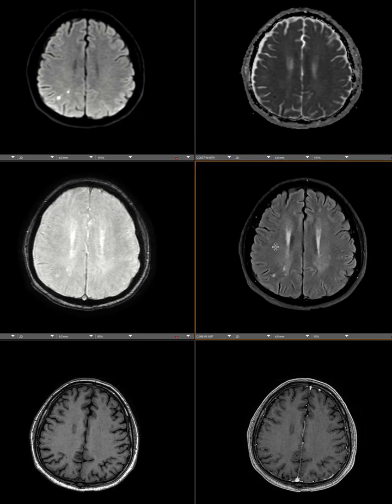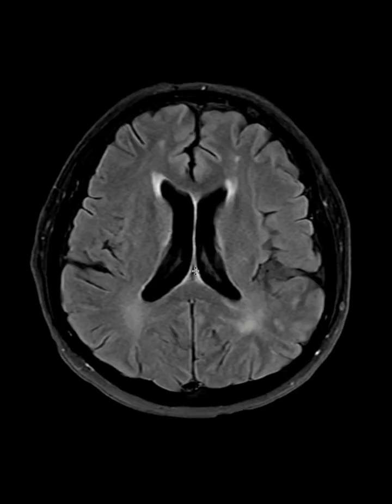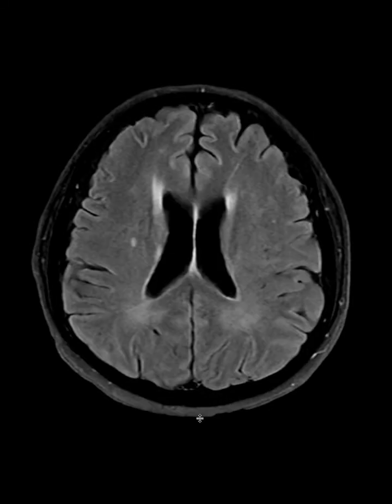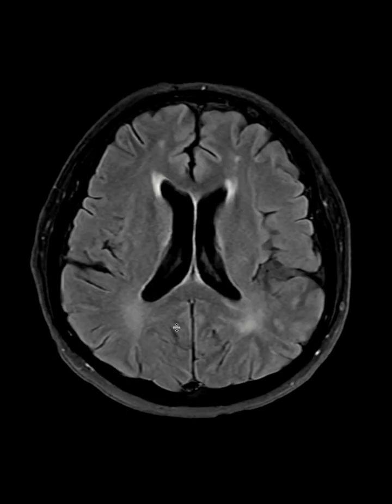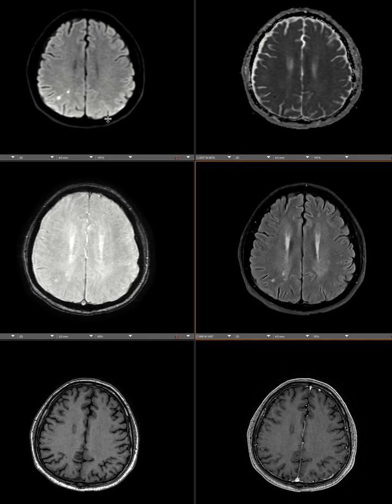And then if you look at this sequence, which is FLAIR, we know that this is CSF which is dark, and then the scalp is also dark here because we have FLAIR FATSAT in this sequence. In our institution, basically, we do the T2 FLAIR sequence with FATSAT. You have this option. And then, on those areas that we had restricted diffusion, we see T2 FLAIR hyperintense foci. So what does restricted diffusion mean?